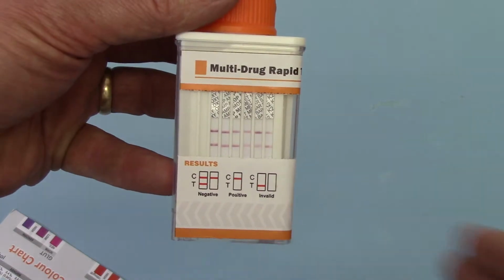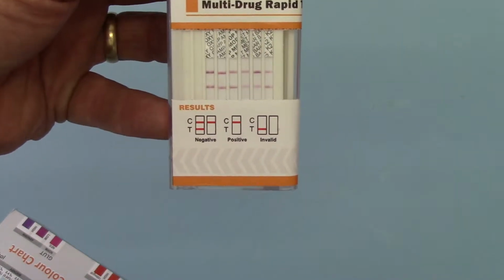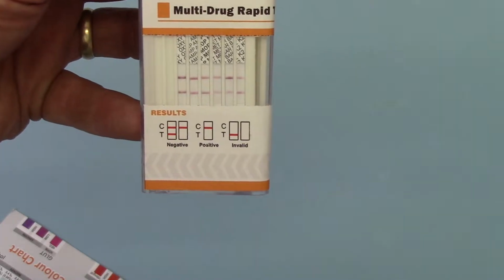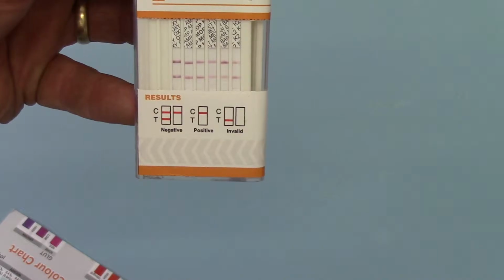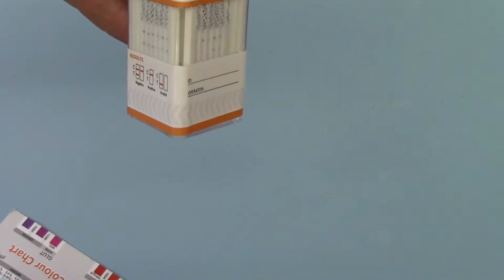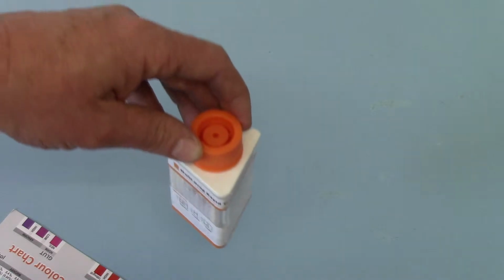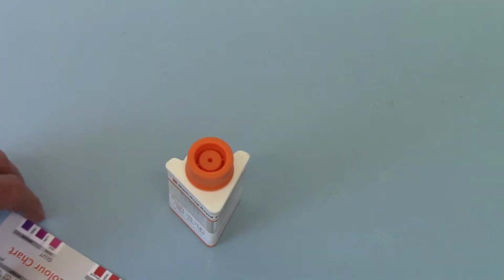If we roll that round onto the other 6 matching membranes on the other aspect of this panel, again, you've got a fully negative test result here with nice, clear control and test lines against each of the drug abbreviations. So that is a complete negative screen for those 11 drugs plus the alcohol, making a 12 drug saliva barrel test. Takes in total between 5 and 10 minutes.